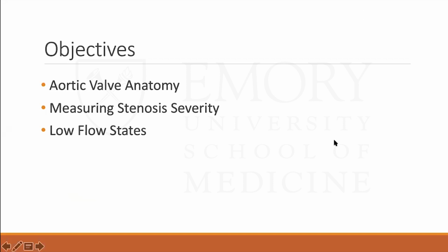We'll quickly go through aortic valve anatomy, and then we'll spend the bulk of the talk going through some images to see how you're actually supposed to measure aortic valve stenosis. And then at the end, I'll briefly cover some issues with the low flow states and how that impacts echo evaluation of AS.